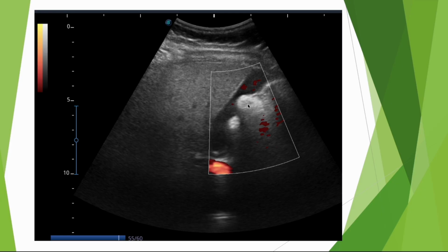Actually, what should stand out to you already is that yes, these images are highly echogenic. Let's describe them in detail. Typically, following ultrasound semiology, there are two highly echogenic rounded images, but they don't seem to show any shadow cones.